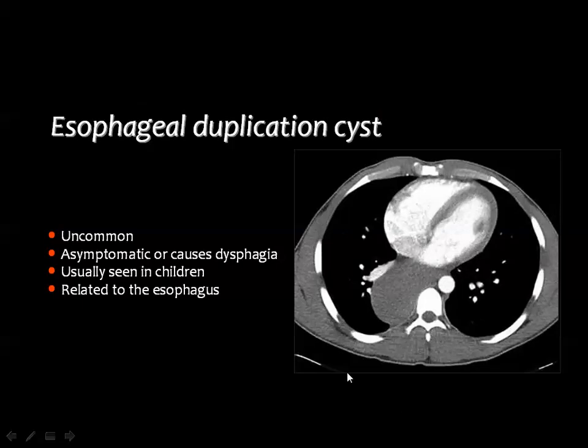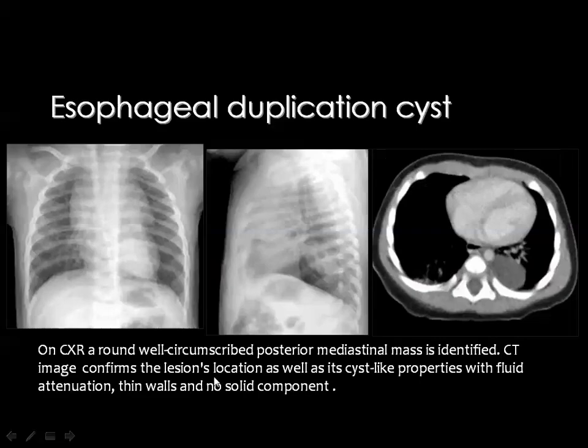And this is a classic example of an esophageal duplication cyst in almost a classic position. You see the cyst is located in the paravertebral gutter, and part of the cyst is insinuating itself between the heart and the descending aorta. This sign is diagnostic that this lesion is not of pulmonary origin. It arises in the mediastinum in this particular area. Then because of the tight space, it has grown to the right side.